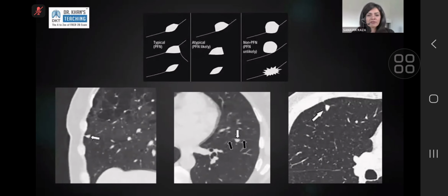Like I said before, the first thing you need to confirm when you want to call something a nodule is to make sure this is actually a nodule. Intrapulmonary lymph nodes are very, very commonly described as lung nodules. Most of the unnecessary follow-ups come by this route, where people have called a benign looking lymph node a nodule. Almost all of us have lymph nodes in our lungs that may be visible on CT. All of us do have lymph nodes in our lungs. Small ones we don't see.